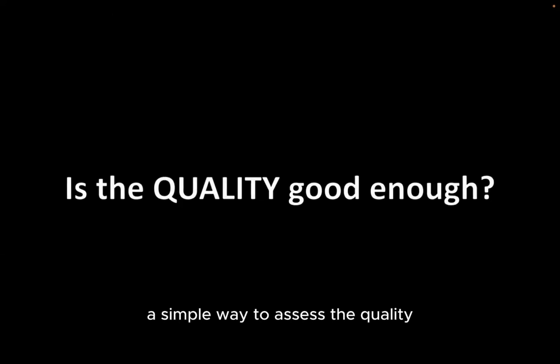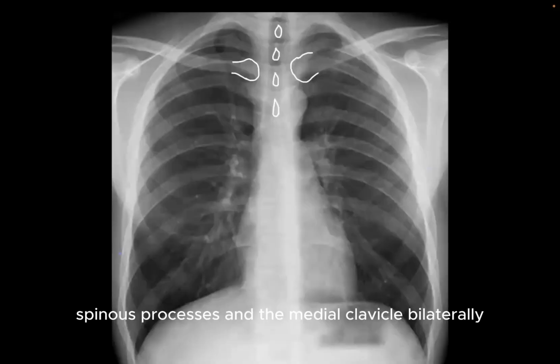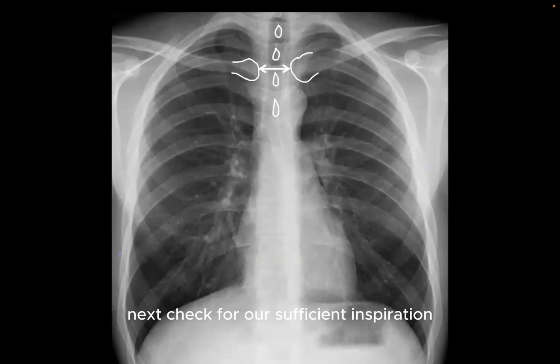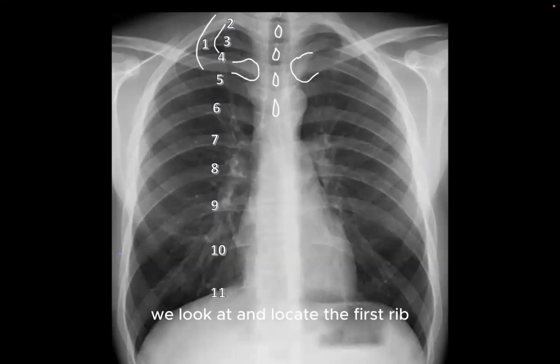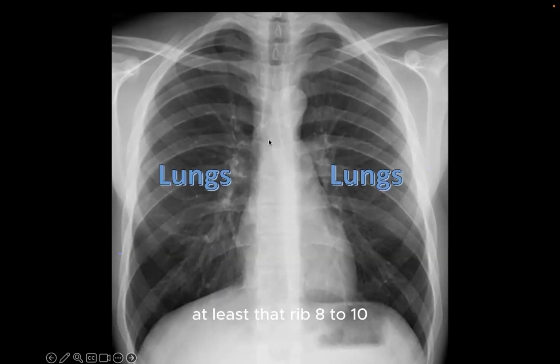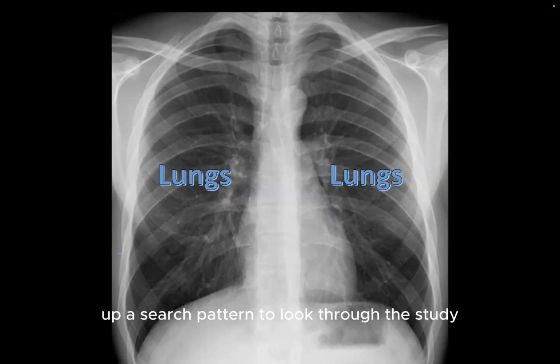A simple way to assess the quality is to check for rotation by locating the spinous processes and the medial clavicle bilaterally, then assess if the spinous process is centered between them or not. Next, check that there is sufficient inspiration. We locate the first rib, and from there we can count the ribs dorsally until you reach the diaphragm. With a good enough inspiration, we want the diaphragm to cross at least at ribs 8 to 10. Next, we need to make up a search pattern to look through the study.